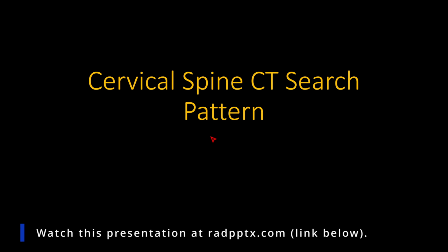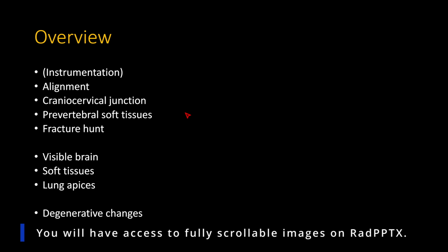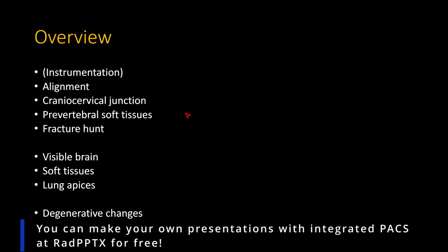In this presentation, I'll be talking about a basic cervical spine CT search pattern. So here's an overview of the steps I go through in a basic cervical spine CT search pattern.